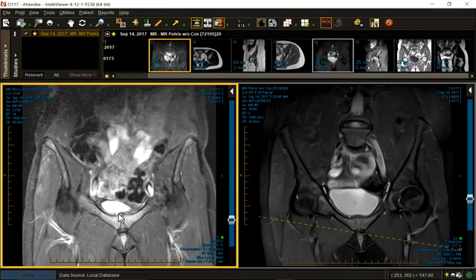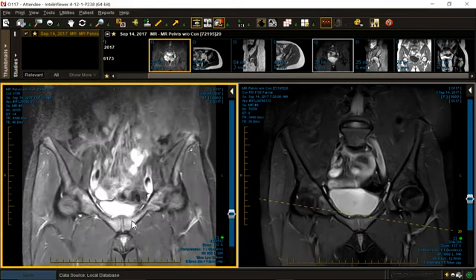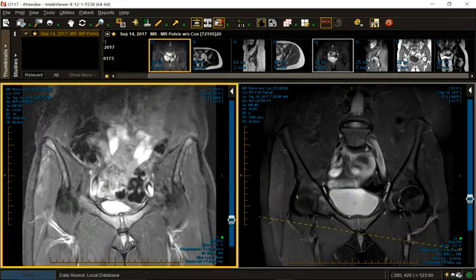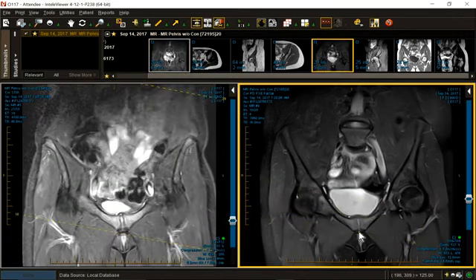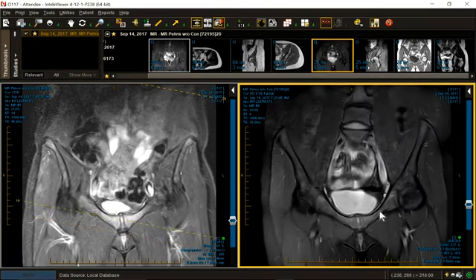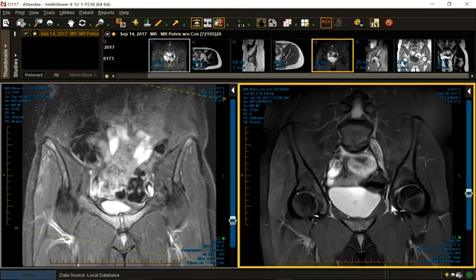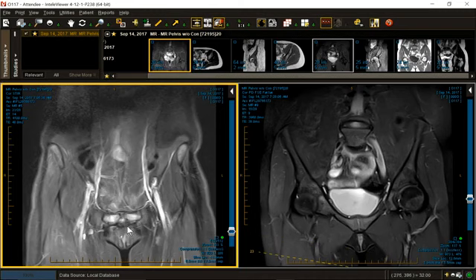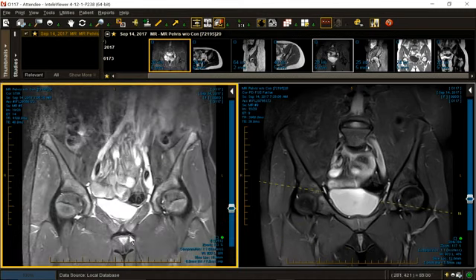There's the superior pubic ligament, distended. Where's the arcuate ligament? It's present right there, still there. What makes this even more impressive is the bilateral osteoedema in both pubic rami, extending to the ischium. This is what happens in athletic pubalgia. So now that we've established that the ligaments are still there, especially the arcuate or inferior pubic ligament, there's a portion of it. There's the thickened, more posterior portion of it.